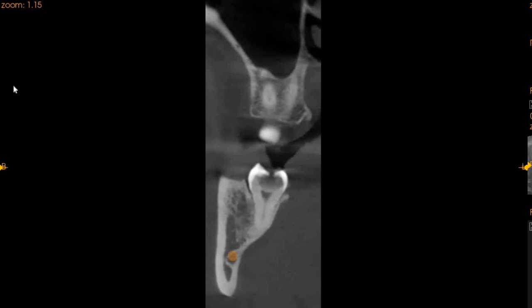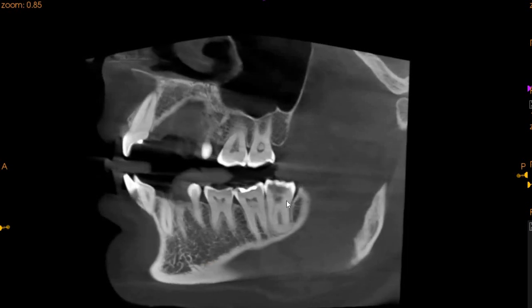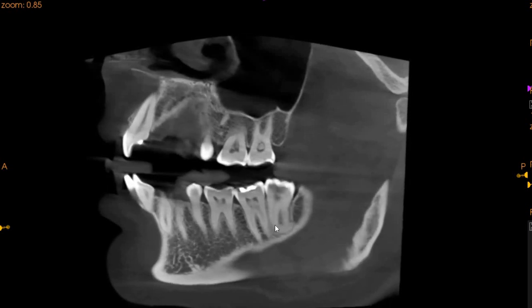The cortical plate on the buccal hand side is quite thick, so hence a lot of guttering can be done and will be needed in order for this tooth to be taken out. The interesting thing about this wisdom tooth is that it's not just present in the ramus, it's also looped around bone, and there is a very huge curvature here as well.